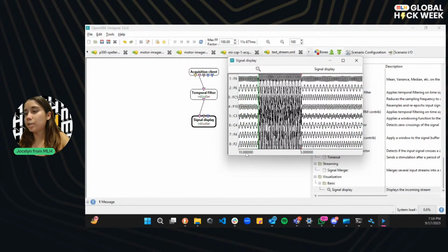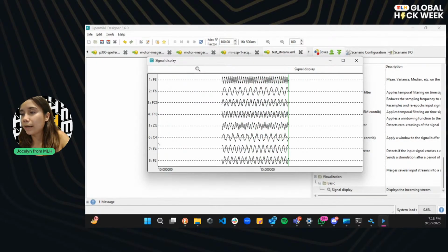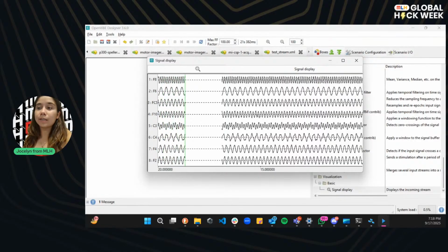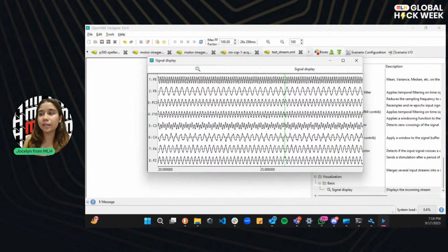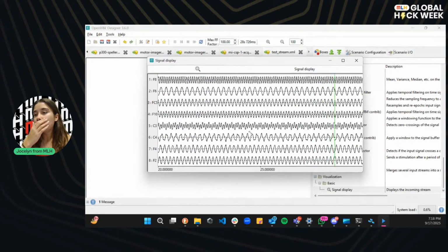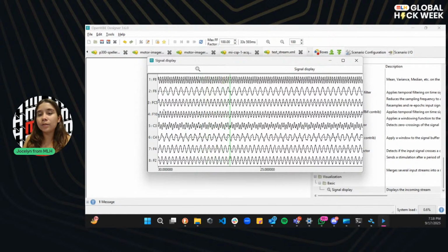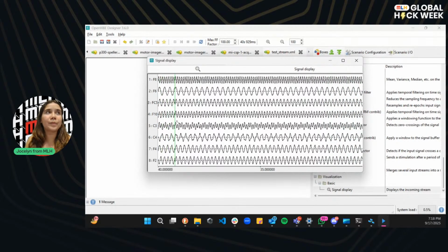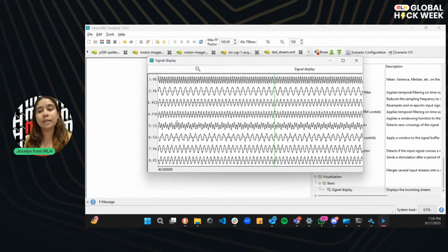If you see, there are some channels that can be read more easily, such as channel 2 and channel 7 and 8. They look really nice. I mean, they look like perfect signals, because these are actually artificial signals, so they will, of course, look perfect as if nothing was disturbing them. But you can basically see how signals with no noise can look like. And depending on the frequencies that you select, is how your signals are going to look. Because if you remember from the past stream, there are different bands for frequencies, and depending on the frequencies that you have, is the mind state that you're going to be having.